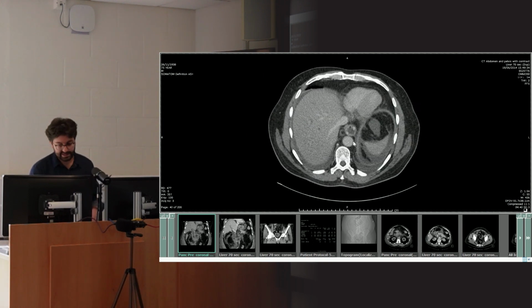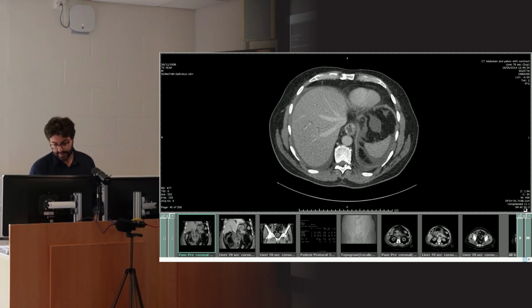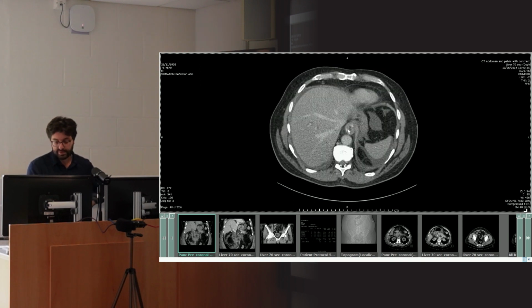Normally, the esophagus is collapsed. So the first thing you would do is get them to reinsert the NG tube. And this is before we've even got to what's actually wrong with the patient. So again, as a radiologist, one of the really important things is looking for those other things that other people won't look for. And identifying a misplaced NG tube can be very important.